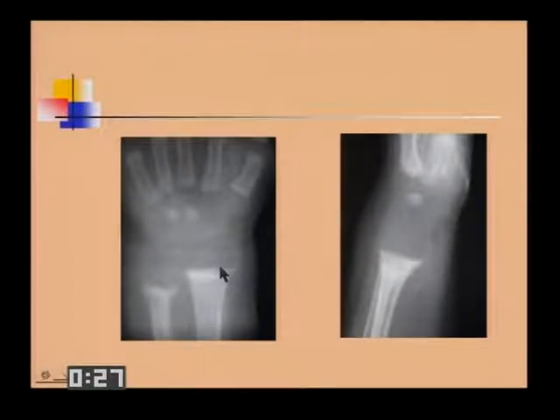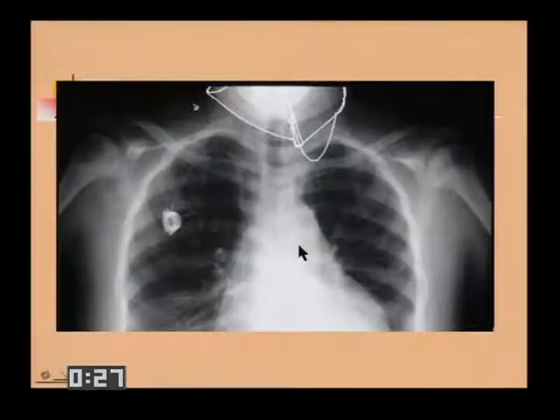Any one rapid-growing joint will show the cupped metaphyseal changes. There's a fraying of the border. You get a delay in ossification, a delayed bone age associated with this. A patient with a central line and abnormal humeral heads, for example, this could be radiation-induced change. It is an avascular necrosis.